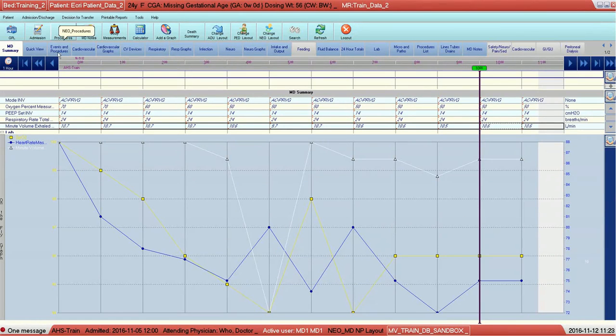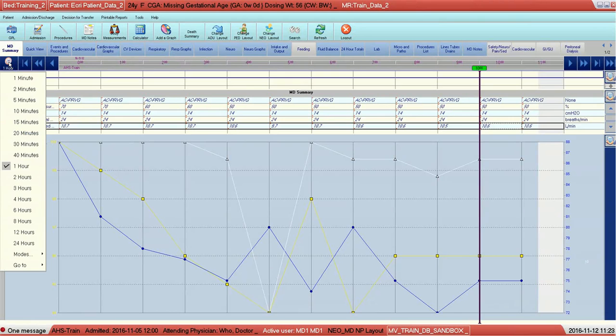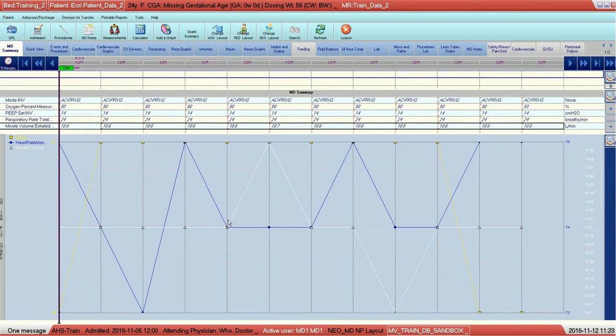And just like with the individual columns, you can adjust how fine-grained you want your data depending on what kind of information you're looking for. You can do this with any variable that's numeric. So things like the mode, as you can see, is not a numeric variable. So trying to graph a non-number is obviously not going to provide any information.